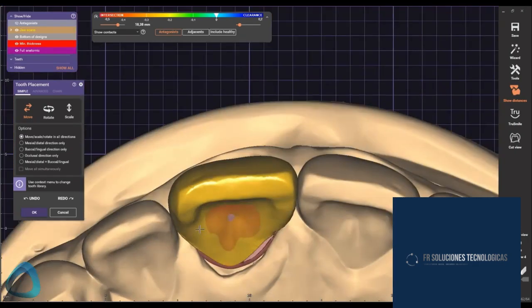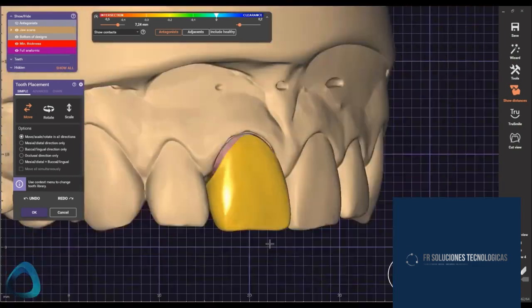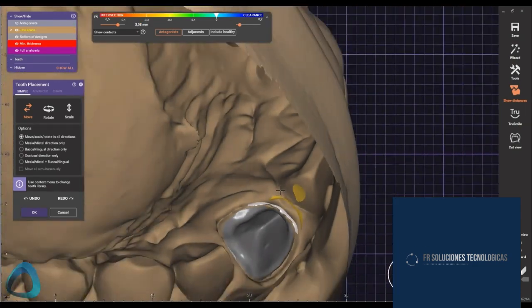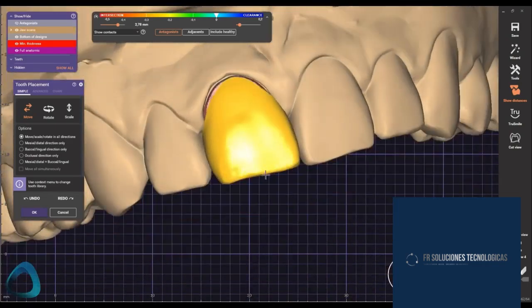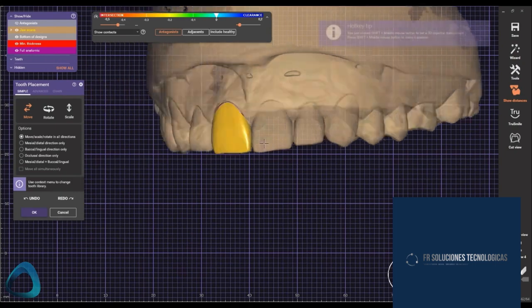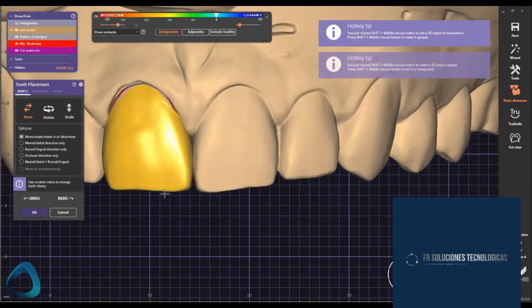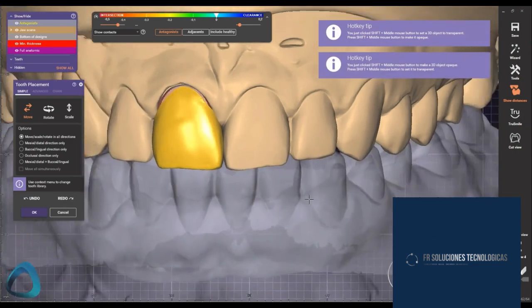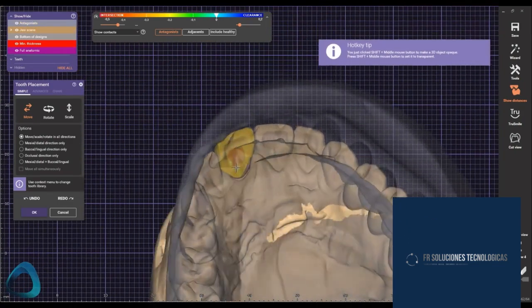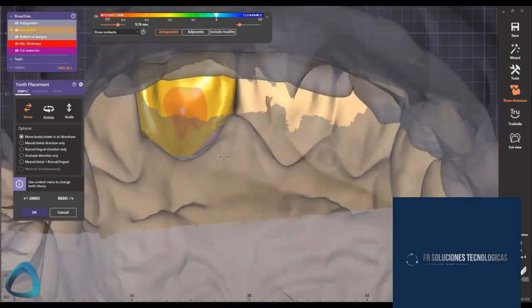Hold Ctrl and Shift, then drag the tooth on a diagonal lingual to distal axis. Look from inside out of the jaw scan mesh and see the contacts. Make the jaw scan transparent so you can see if the contact area is ideal or not. Bring out the antagonist mesh and see if the occlusal is compromised. Remember that this is a placement step only and we still have the free form and adapt to finish the case.